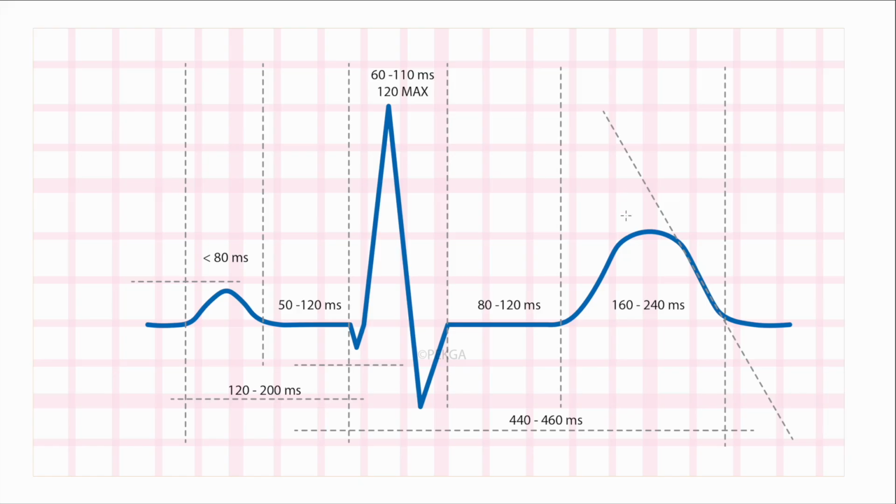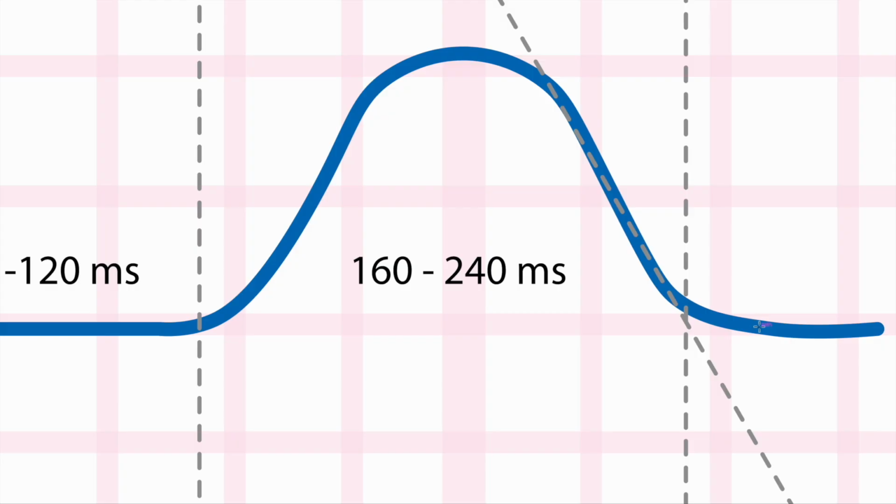This is not the best graphics, but if we go back to this over here, that's why you have this broken up line, right? This is the end of your T wave. So this is your isoelectric baseline where the sharpest slope of the T wave intersects it. So see how here it appears that the T wave comes back to the isoelectric point right here? That would not be the end of it. It would be wherever the sharpest slope intersects it.